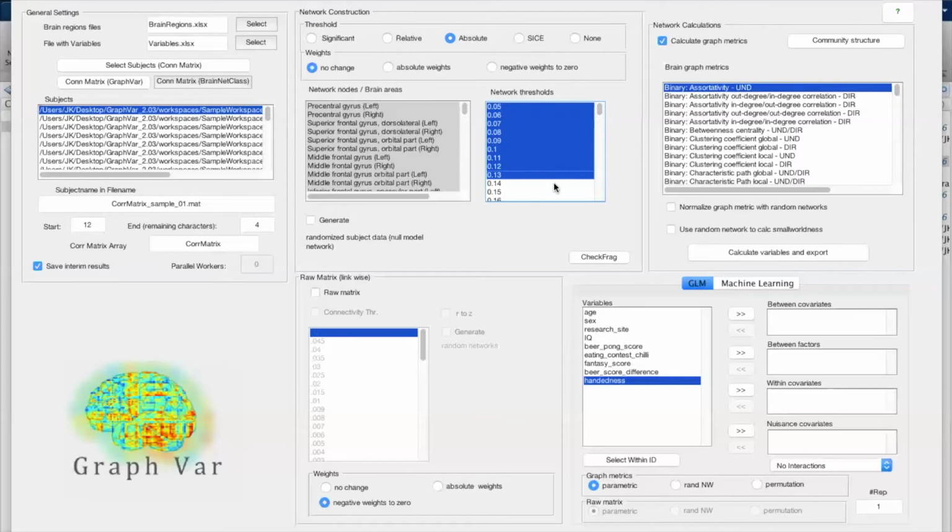And you will make false inferences about the actual differences of graph topological measures, because this will, as I showed in the other videos, impact the network topological structure.